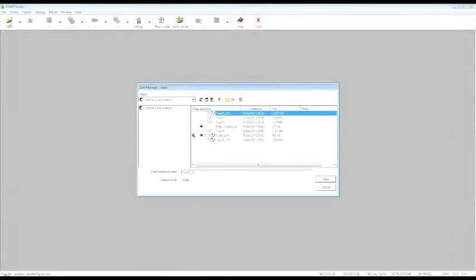I'm now going to start with the first option, so I'm going to select Open, and I'm going to select the Webinar Smart Analyzer folder that contains the data that I'm going to show you as an example. I want to start by considering trial number 1, and as you can see, we have on the side of the name of the trial a cross icon. That is to signal that this trial contains some raw 2D kinematic data inside.